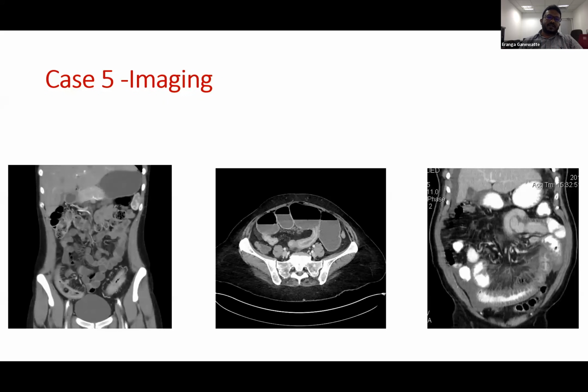So in these patients, if you're suspecting a small bowel lesion, a CT enterogram or an MR enterogram will definitely give the clue. In the first image, you can see periluminal inflammatory changes with narrowing and stricturing, and this prominence of the vasa recta is called the comb sign. It's like a comb. You can see the prominence of the vasa recta, and you might also get a little bit of ascites because of this ongoing inflammation.